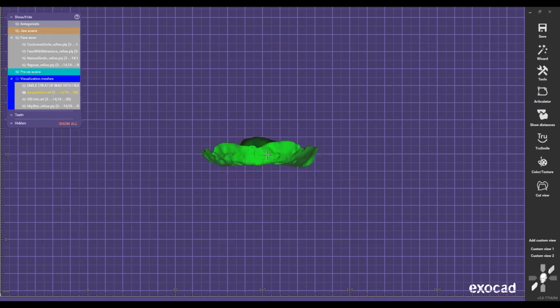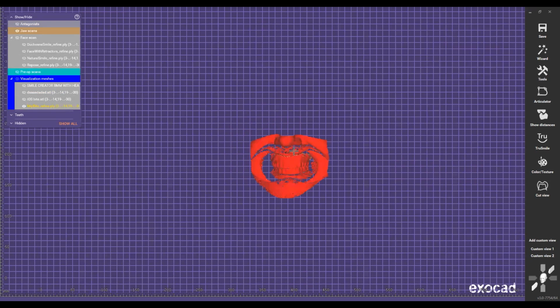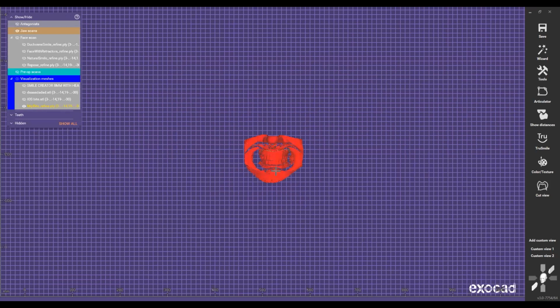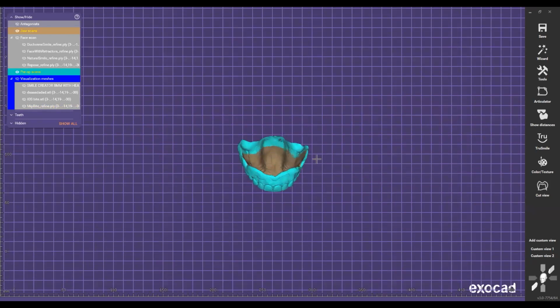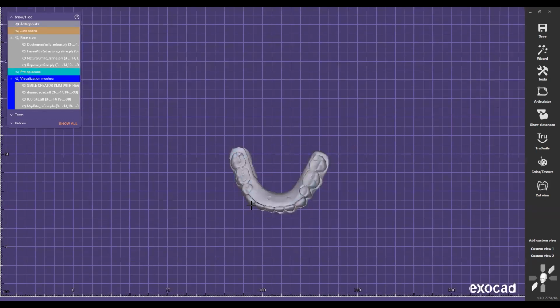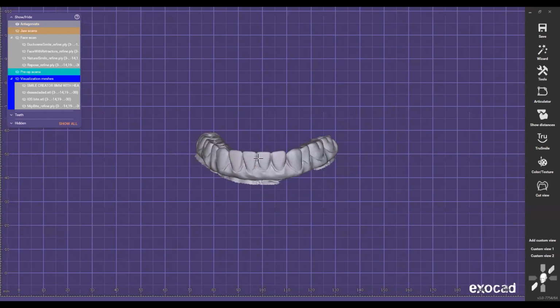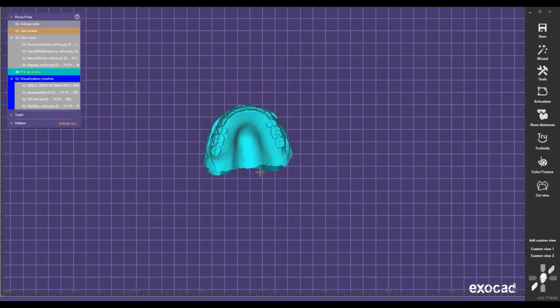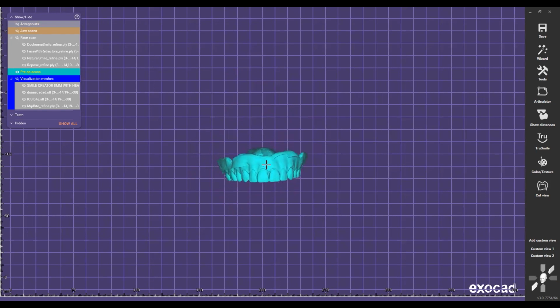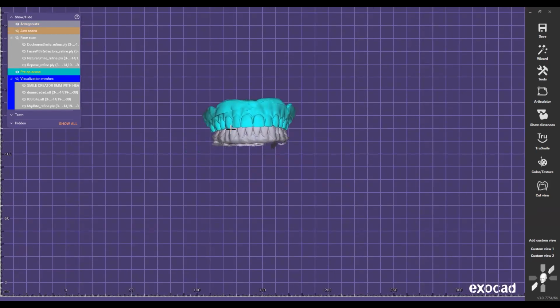There we go. So the records that we acquired for this patient were pretty much scanning the bite, scanning the pre-op upper denture. We did a wash right here, and then we scanned the lower. The patient already had a lower case. I believe this is a conversion or acrylic with denture teeth as an opposing. And the patient was wearing an upper denture here, and the patient wanted to have a fixed screw-retained bridge on the upper. So he was tired of his denture. So we said, okay, we can help you. Let's get it done.